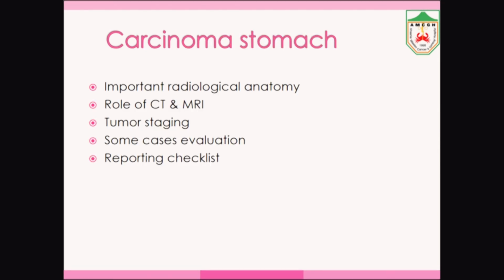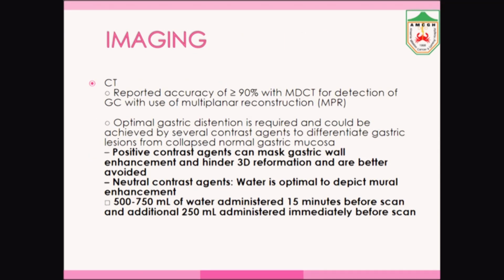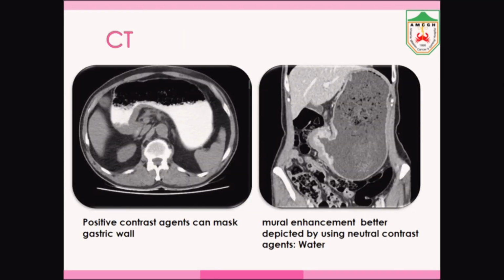Now the carcinoma stomach. There is a reported accuracy of more than 90% in MDCT for detection of gastric carcinoma. But in case of positive contrast agent use, it masks the wall enhancement, so we are using water as a neutral contrast agent to depict the wall enhancement.